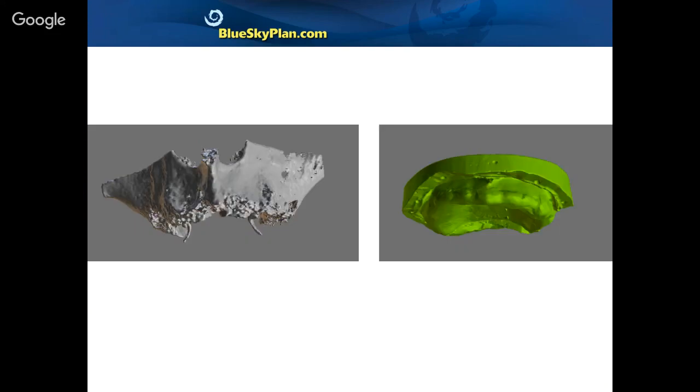The challenge of creating a surgical guide for an edentulous arch is that there's no teeth. There's no teeth for placing the points. And of course, when you look at the CT scan of the patient's bone and you look at the model scan, which includes the gingiva, you don't have common surfaces where the points could be placed, and they're clearly not identifiable in order to do an accurate merge. So those are some of the challenges that we're facing with an edentulous arch.